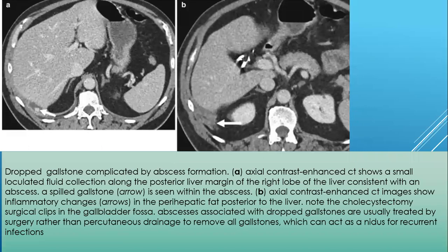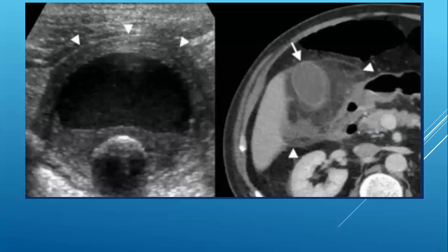each حالة drop gallstone يحتاج لها إنه تنفتح ثاني مرة open surgery و evacuate الستون، يعني ما ترام لأن percutaneous evacuation. هنا نشوف ultrasound with CT scan اللي هي layering thickness of gallbladder, stone, bile sludge. Now the CT inflamed fat around with thickness of gallbladder. Now الماكسيموم طبعا intensity مالتها وهاي الانفلاميت مالت الفات around. هاي الفيتشر مال cholecystitis acute cholecystitis.